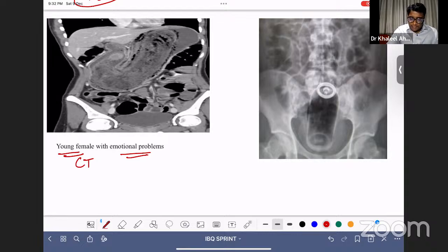What do you see on the CT scan here? You can see a distended stomach, right? With a lot of heterogeneous areas within. Very nice, Keval, Nikki. Very good. You are seeing a grossly distended stomach with heterogeneous opacities in the stomach. This is trichobezoar, right? So very good, Sana, Rishabh, Nikki, Keval, right? You guys got it. Nice. What is this one?